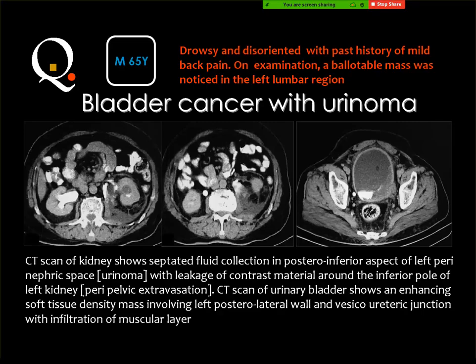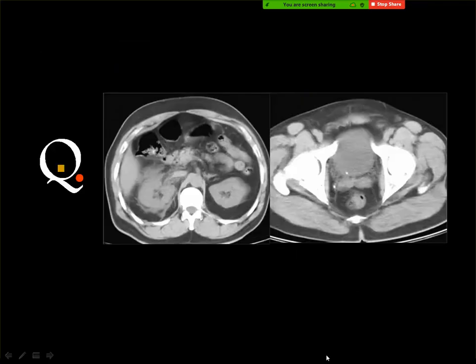This is the perinephric fat. The perinephric fat. Normal perinephric fat. Okay. Dirty fat around the right kidney, and there is a stone in the bladder. Right, small stone obstruction in the right ureter. Okay, where is the stone? The vesico-ureteric junction. This one? No. Another. Yes. Okay. Yes, this is good.